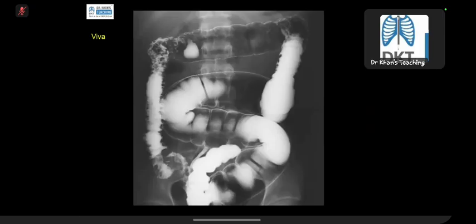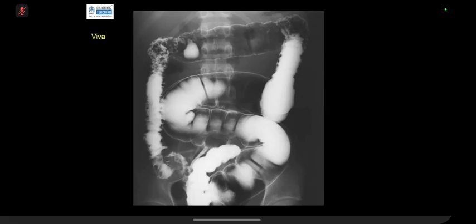UC or Crohn's? Why? Excellent. Skip lesions and deep ulcers. Excellent. So if you see the deep ulcers in profile, versus end on. Of course, that is end face view of aphthoid ulcers. But deep ulcers, deeper than aphthoid ulcers, are rose thorn ulcers.